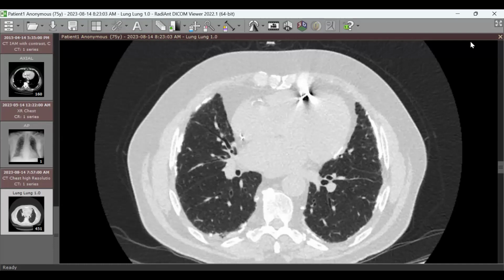But in terms of occupational lung disease, the disease that causes this kind of bilateral pleural plaques is most likely asbestosis, right? It is not silicosis or pneumoconiosis. Plaques plus pulmonary fibrosis, exactly. So it is asbestosis. Okay. So now, are you satisfied?